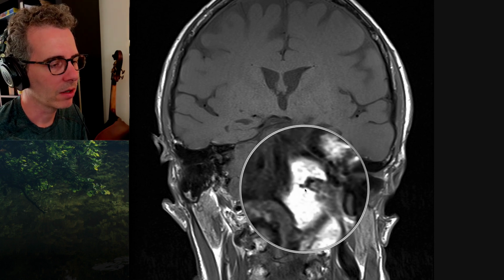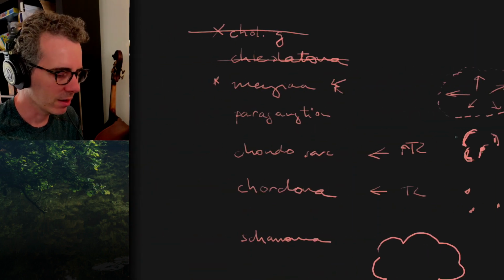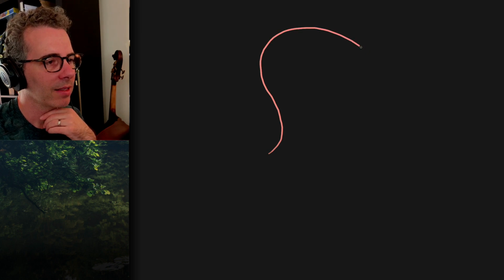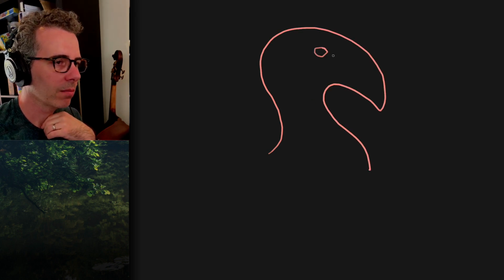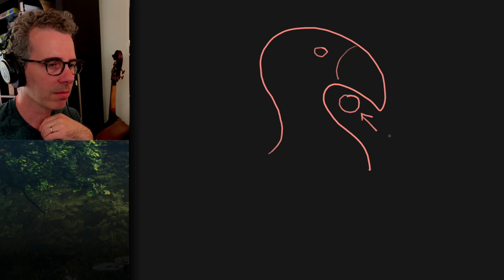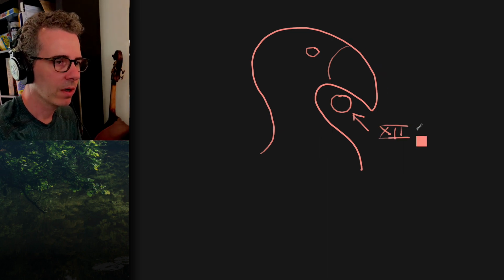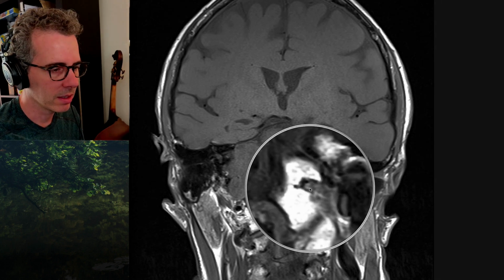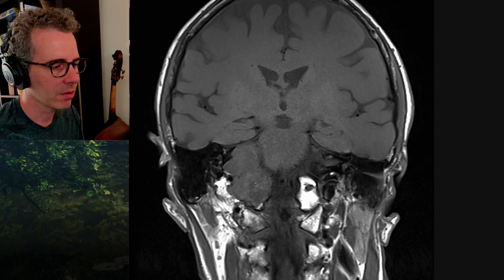I hate signs. Well, I don't hate them, but this is the eagle sign. And because I'm finding a new love of drawing, you have a sort of bald eagle looking thing with a beak. The hypoglossal is under its beak. That is a very easy to identify landmark. So there it is. That's the hypoglossal nerve tucked in under the beak. And when you look at the other side, that's pretty much the epicenter of this mass.